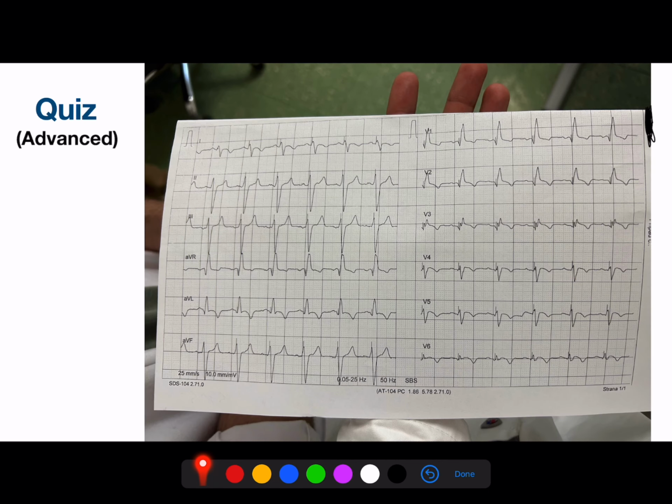And this is an ECG that I took a picture of a while ago from the clinic. So you see what else can be wrong. It's not important that you know it, it's just nice to know because you see it very often in the clinic. Again, here's activity. There's a P wave in front of every complex. Here's a P wave, P wave. But the PQ interval is also below 200 milliseconds, so it's fine.